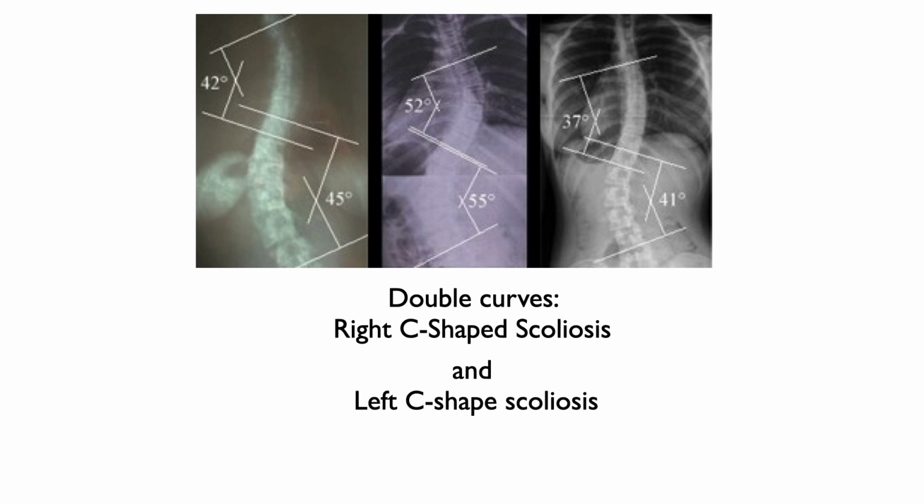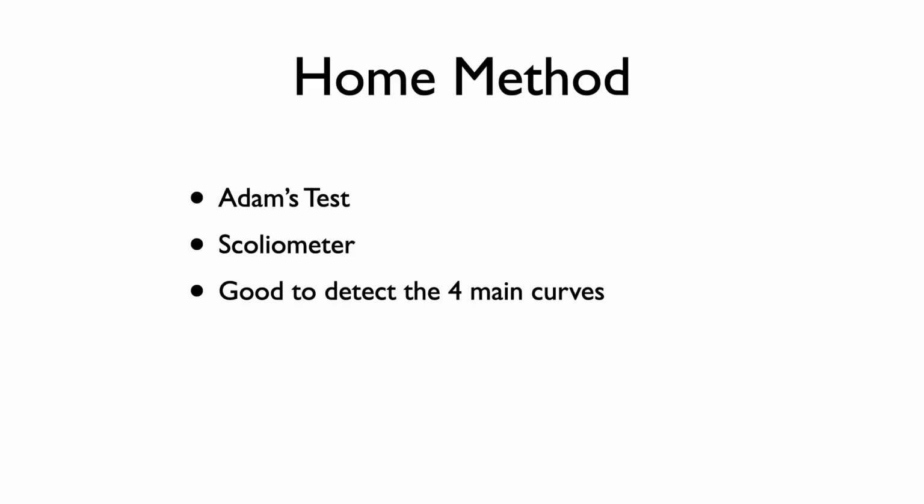Now these curves are actually quite balanced, meaning the top and the bottom curves are nearly equal. But it isn't always like this though. Sometimes one curve can be almost double the other curve. And whichever is biggest is referred to as the primary curve, which I mentioned before. And it's often best to start by treating the primary curve with exercises, as the secondary curve, the smaller one, will usually decrease if the one that's bigger than it is dealt with.